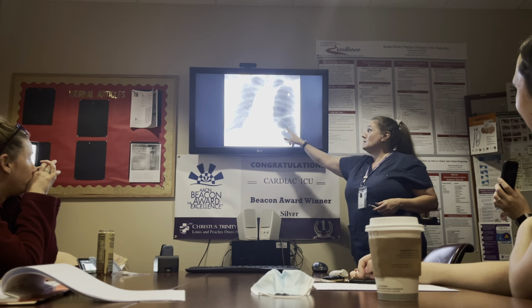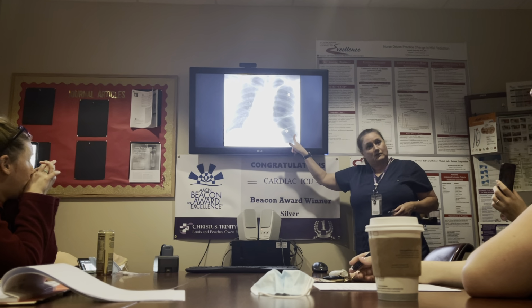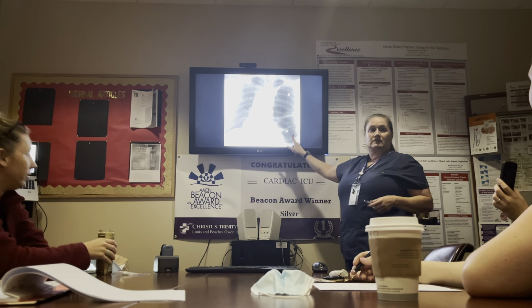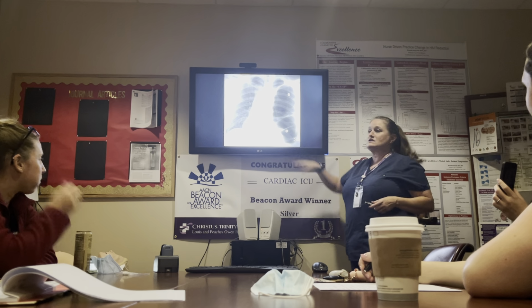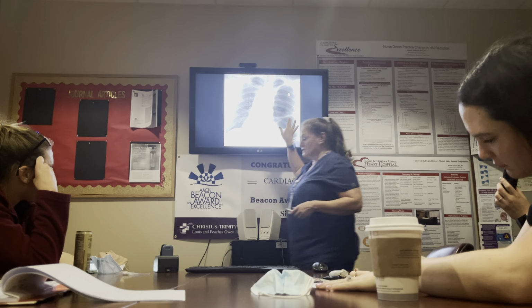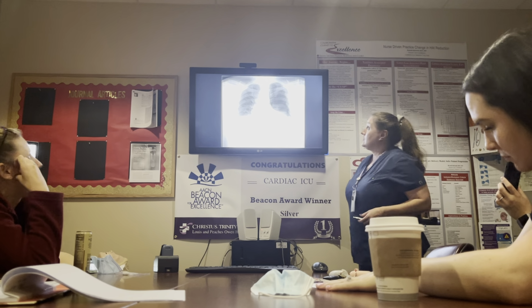But I would not stick a chest tube in that. Some people have, because they thought it was a pneumothorax, and it's not. It's basically a ruptured diaphragm, and you can tell that because you've got haustral markings there, the ringed markings of the colon.